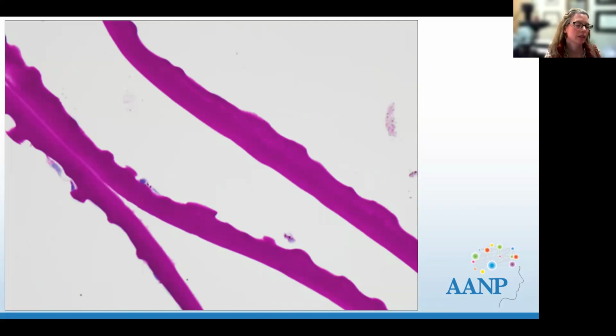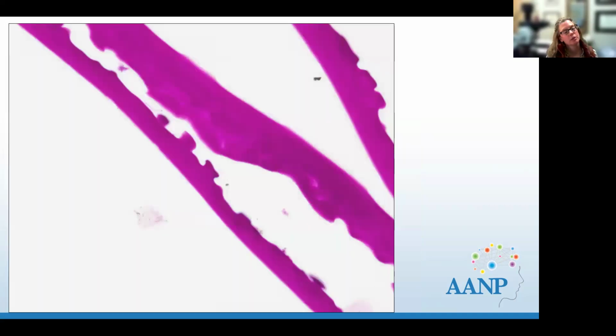And I often give a count, and a lot of colleagues do that as well. How many endothelial cells per high power field? Okay, here's an example of a really thickened one where they're buried. And the majority of the cases that I see look more like this one on the left. But sometimes you'll have to look internally for the guttae.